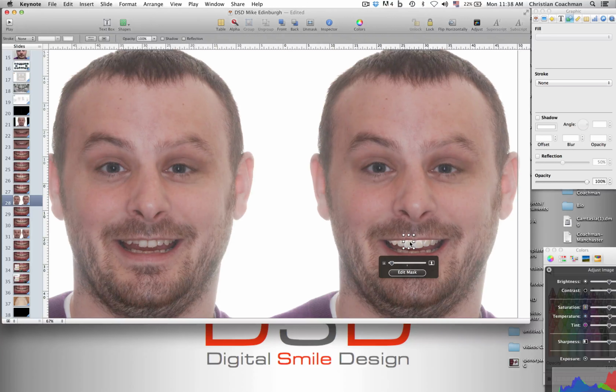Now, of course, I can move the teeth as I want here. It goes behind the lip. And so, why does the lip look so good though? It's the same picture. I know. It's exactly the same. So you have duplicated the picture. This is almost like there's two pictures of this, but you're only seeing this bit of the picture. So I have the pieces here. Okay. They're perfectly overlapped.